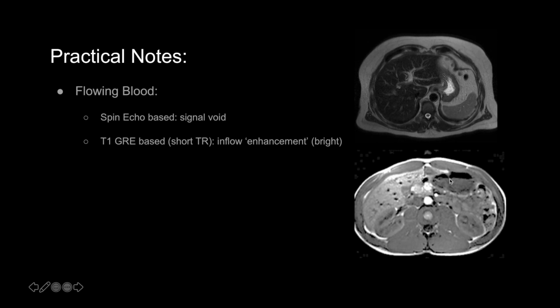So these are in fact non-contrast images, but it's a common pitfall and common fake out. It looks like a contrast image because the aorta is bright, but it's not. This bright aorta is due to this inflow enhancement that is an artifact.